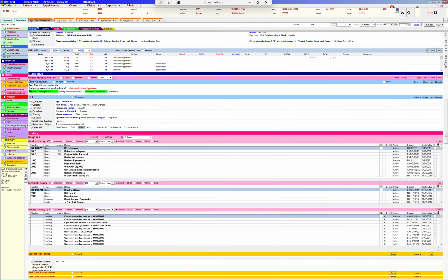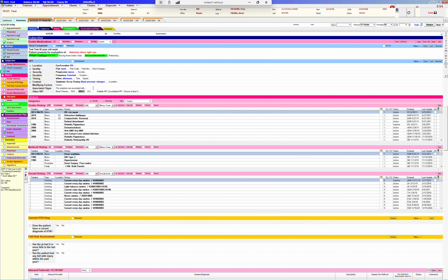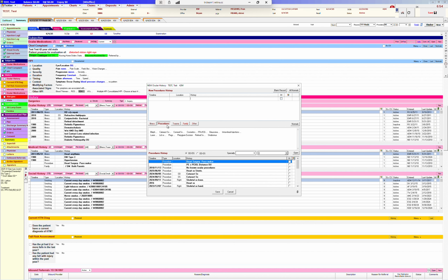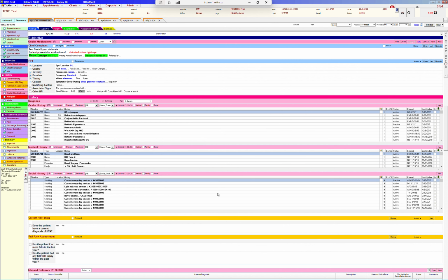We then go down to the patient history. We will have put in dilating drops when we finish the pressure exam. So now the patient's dilating, and we will talk to the patient. We're asking them what their chief complaint is, what their history of the present illness. Do they have any new ocular histories? Say, did they recently have cataract surgery? So we'll say procedures, cataract surgery, and that they've had posterior chamber IOLs. And we'll catch a location, say in the right eye, and say they did it now, cataract surgery 2025, right eye, and say save.